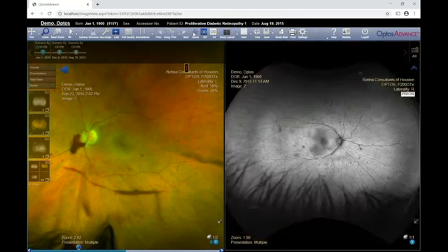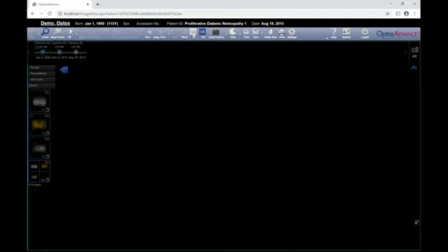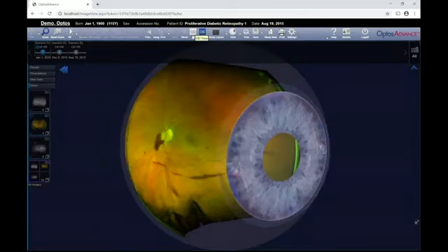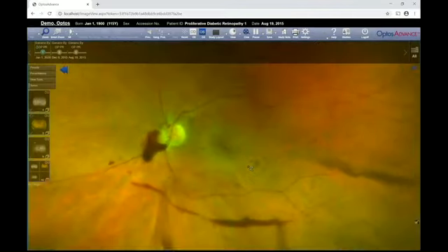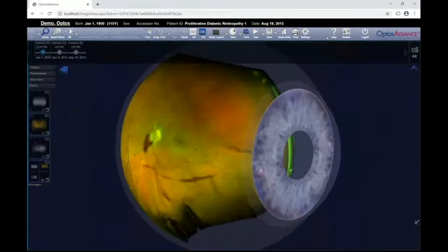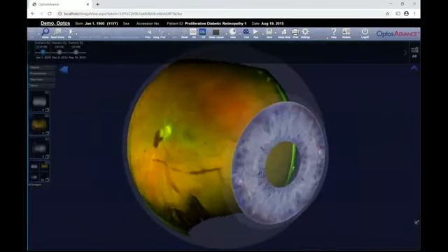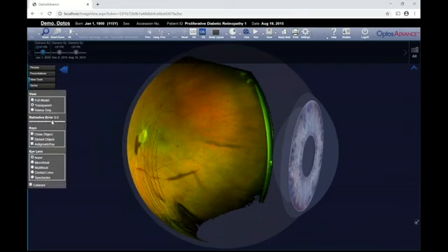3D Wrap is a useful patient education tool, which can be found as the final stage of the hanging protocol by pressing the Next button. Pressing the space bar will allow you to play or pause the cine movement. You can manually zoom and rotate the 3D wrap using the right mouse button and left mouse button. You can manipulate the eye model to simulate refractive error, cataracts, etc. by clicking the View Tools tab located on the left side panel.